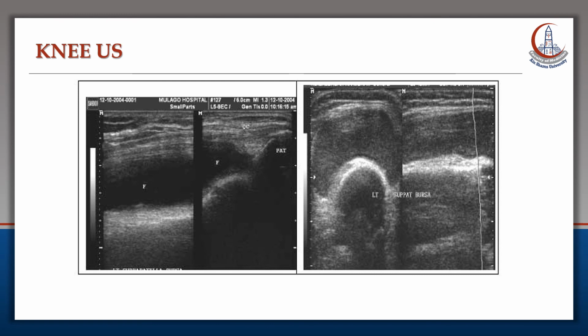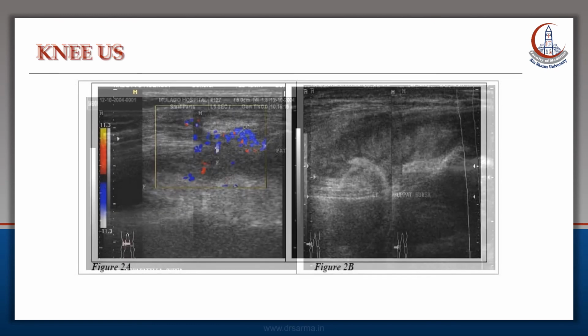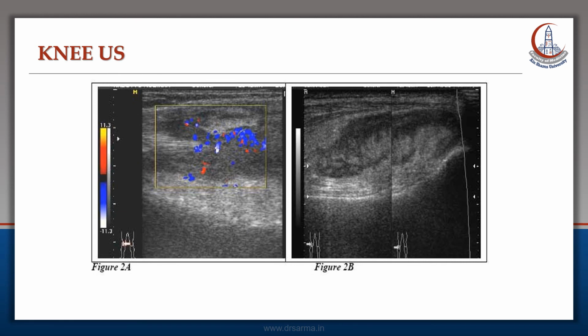Where is the problem? The problem is here when there is mild effusion associated with huge synovial hypertrophy, which may exhibit Doppler signal or may be inactive synovial hypertrophy. In this condition, this is a difficult case for aspiration, as this hypertrophic synovium may plug the aperture of the syringe or even the cannula, prevent aspiration, and will be severely painful to the patient.